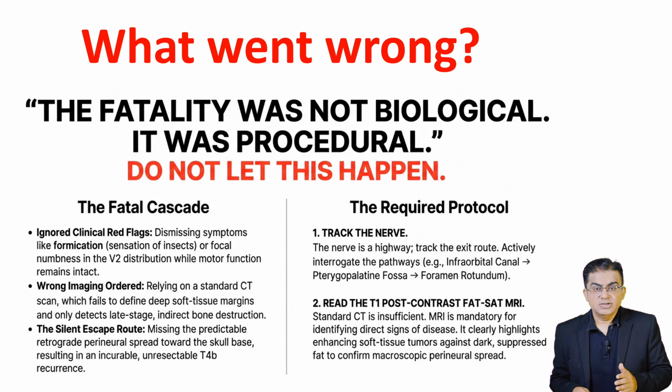Do not let this happen to your patient. Do an MRI. Read the T1 post-contrast fat SAT sequence and track the nerve. Do not let this happen to your patients. Leave no stone unturned to rule out perineural spread before you even start thinking about admitting him for surgery.